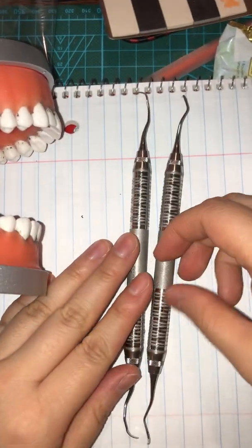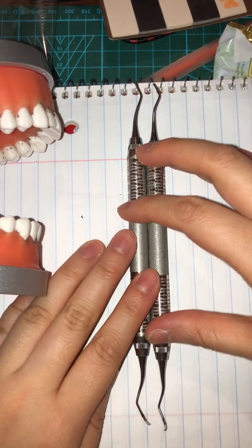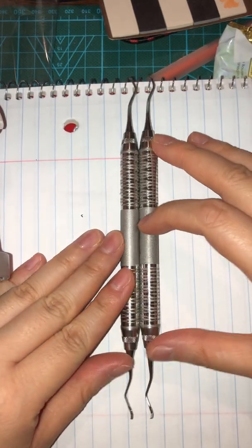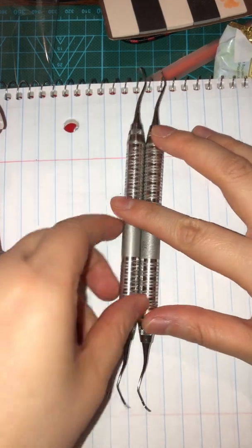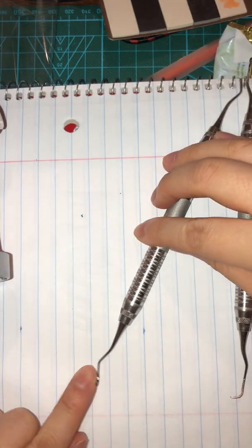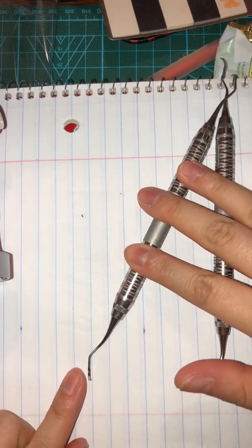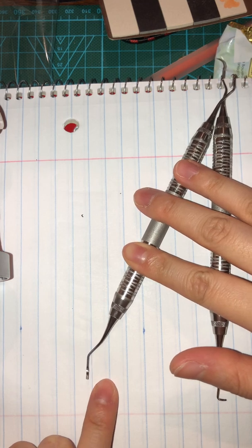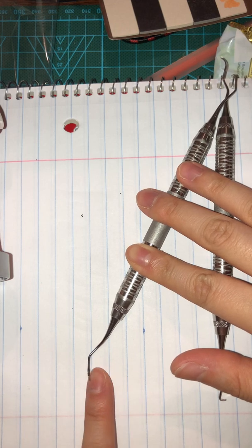And this is for right-handed clinicians. If you're left-handed, you will have to figure out a way how to look at it and adopt the concept. So the lingual side, I would have to roll it until my terminal shank is kind of straight, and then by using the reflective light, I know that this side is lower.